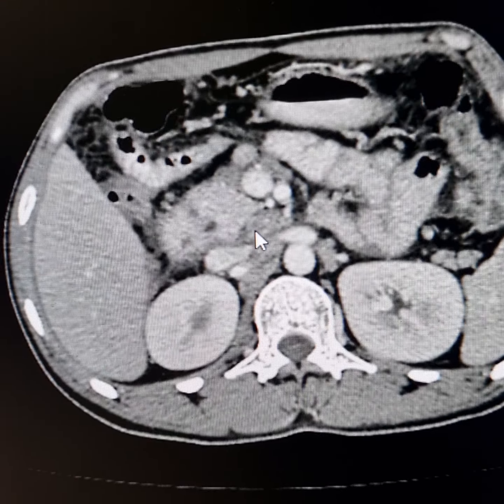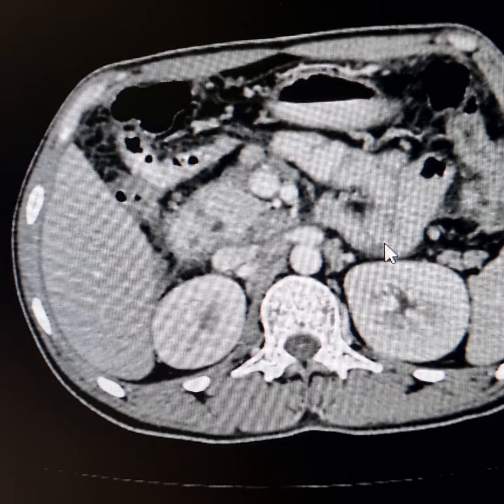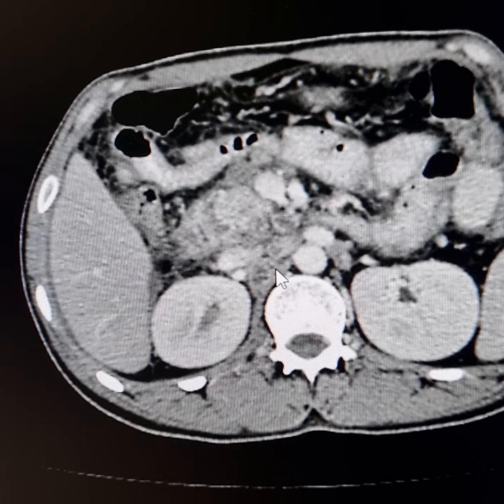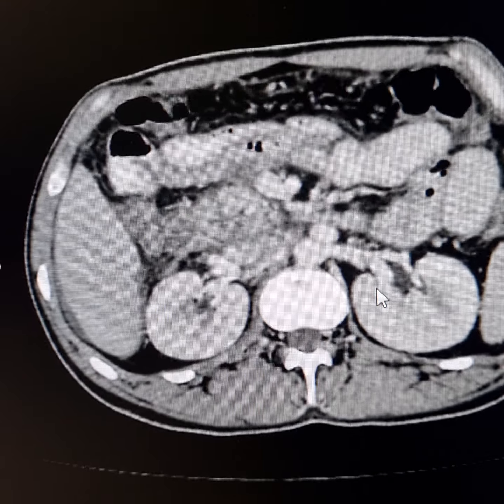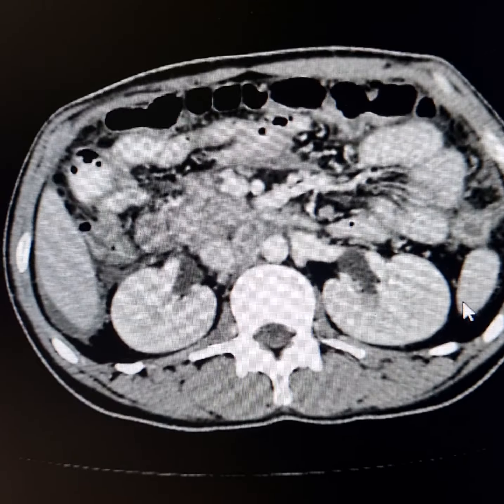No, this one here. Typical features of marginal enhancement and central necrosis. Similar enlarged lymph nodes are also present in the left para-aortic region, in the inter-aortocaval region, in the retrocaval region, this one here adjacent to the right crus of the diaphragm. All these lymph nodes.